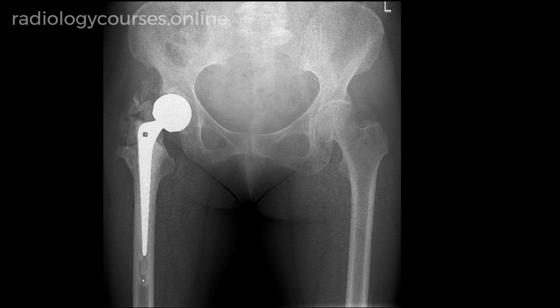So in summary, here I wanted to show a case of grade 3 Brooker heterotopic ossification, or severe heterotopic ossification, in a right hemi replacement. The clinical symptoms can correlate very well with the degree of heterotopic ossification. And I also note in the report that there are no other complications associated with it.